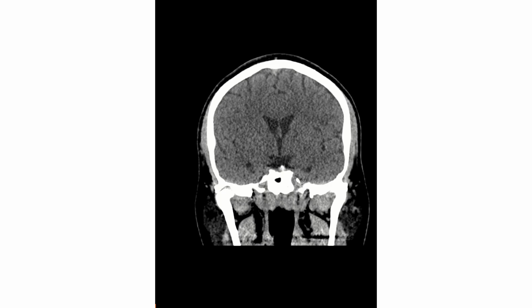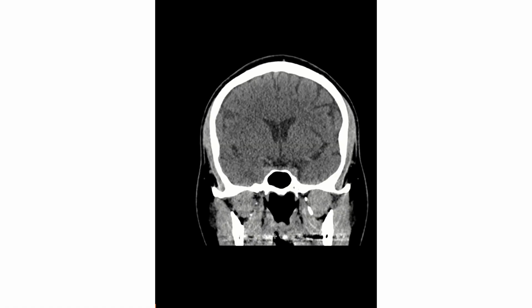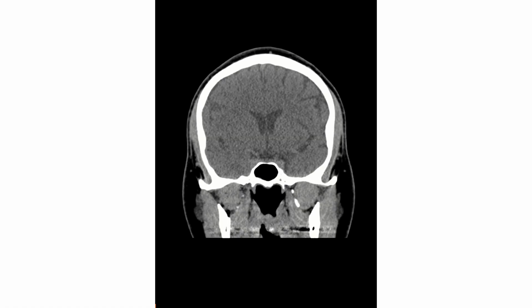Okay, I just want to make sure that you guys always know to pay attention to other structures. Just don't focus on the indication. We need to know if there's an incidental finding, any parotid tumors, any nasopharyngeal tumor, or any skull-base mass.